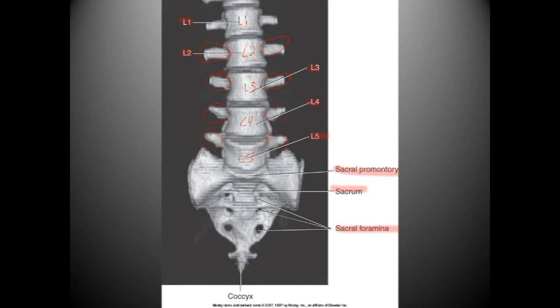And we have the intervertebral disc base. But one of the many problems with volume rendering is that when you focus on the bone, you tend to lose the disc. And so sometimes it becomes very difficult to actually demonstrate where an abnormality is, because when you're looking at a volume rendering, it's typically for bone or bony problems.